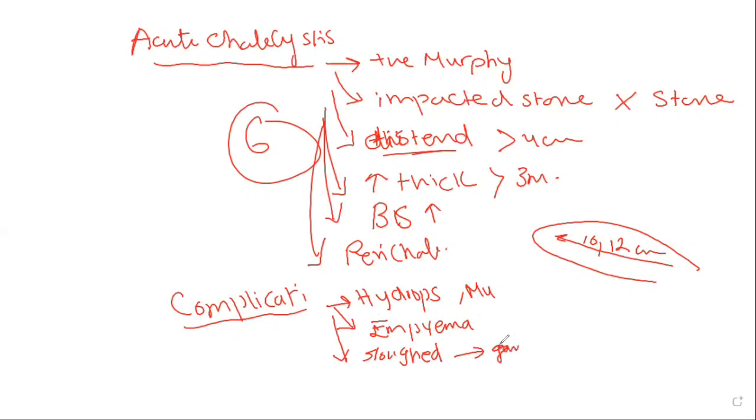This is the gangrene. But don't forget that the patient might not be suffering too much if he is diabetic. Do not forget this probability, okay? And then there is the perforation, and formation of abscess around it or pericystic fluid, and then there is the emphysematous or gas-forming organism. If I am suspecting it and I don't see the reverberating shadow clearly, I would order an X-ray or CT, and I would see them clearly.